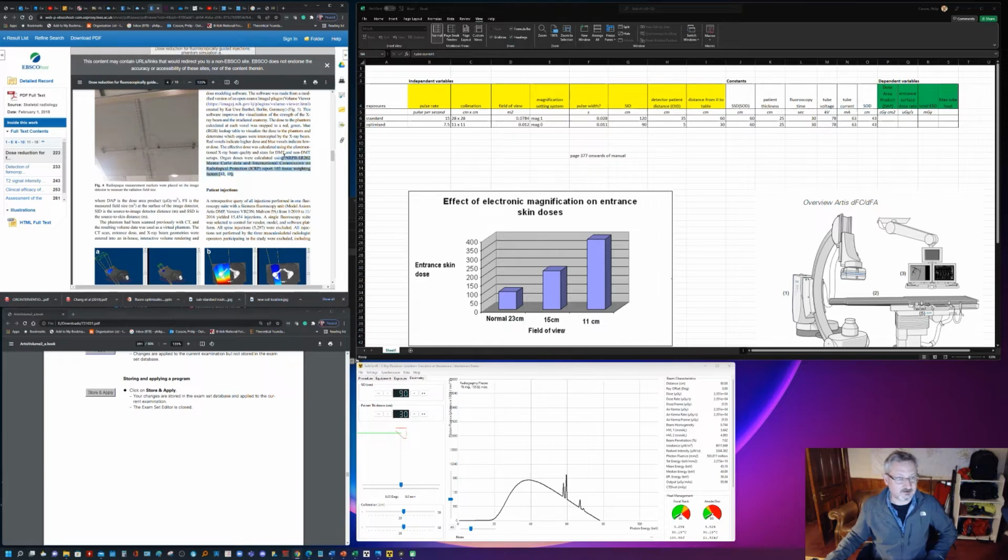So it's not complicated, but it's time consuming and you have to deal with a lot more stuff. And as you can see, I've already got 4 screens going here, so I'm going to leave that out. So we haven't got effective dose, but we are going to calculate the dose area product and we are going to calculate the entrance surface dose. They use different units of dose, but I'm going to just use the units that my simulator produces.